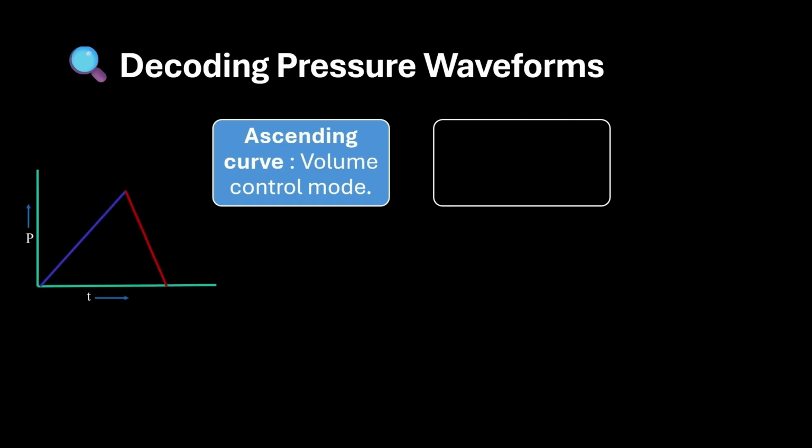There is a peak pressure here which is observed, and a steepness, a slope. This is the pressure time inspiratory slope, and it reflects the lung compliance. A steeper slope indicates lower compliance. This is very important information.